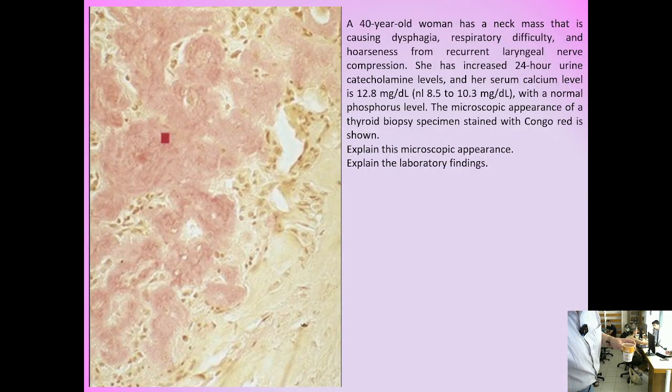All right? Now look, do you remember these tumors of the thyroid gland, the medullary carcinomas? What do they secrete? And we can see it in the tissue sections. We saw it yesterday. Amyloid. So this is amyloid, and you see the specific histochemical stain, Congo red, which stains the amyloid this color. You see, yes? Only the medullary carcinoma produces amyloid among the thyroid carcinomas. So let's have a look at the patient's history.